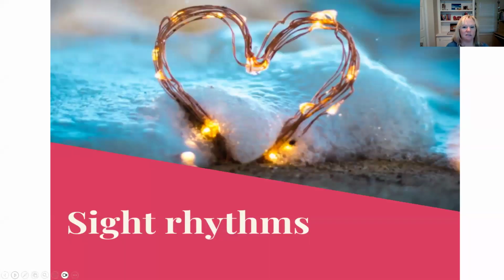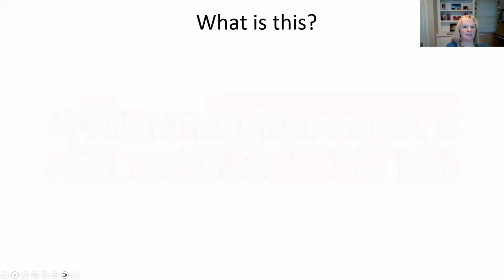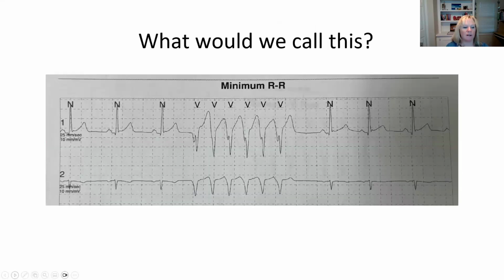And then let's do, well, we did these already. We did the VTAC, but what's this? What will we call this? This is called a run of VTAC. Good, KJ. Okay, we would call that because it's fast, regular, wide.